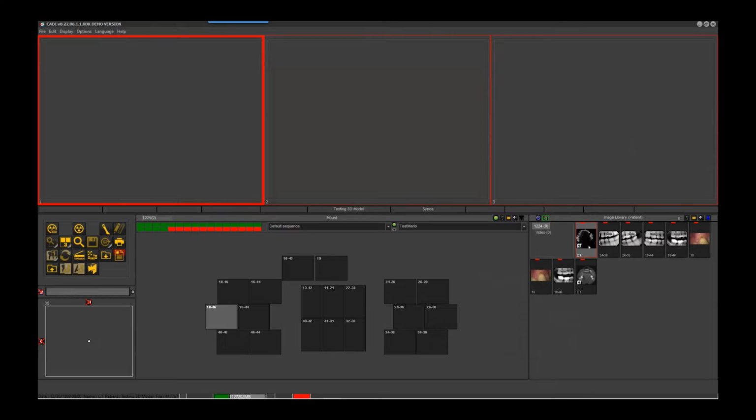Yes, that's exactly it. What you're seeing here is the Polaroid DDS desktop. Right there, where Maria has the mouse, that would be the CT files. You can see they are labeled CT files versus the other images. And like Bob said earlier, that is our main library where everything comes into. Does that make sense? Yes, it does.